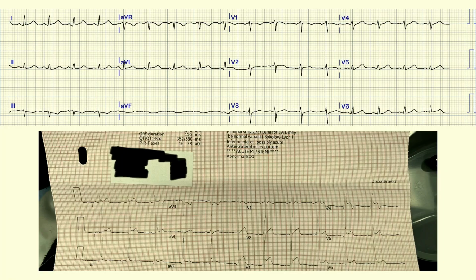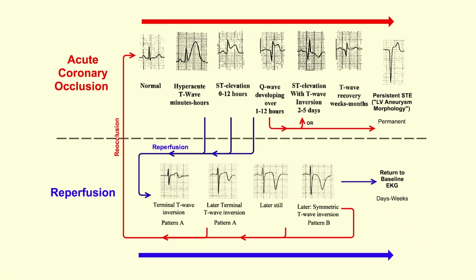ECG can be really subtle, and understanding ischemia is not as easy as they may have led you to believe. I think this is probably the single most important image that I feel was never shown to me, which is the dynamic nature of acute coronary occlusion. It's not just this fixed thing where they're at home, they get a STEMI, and then it just stays right at that 1 millimeter cut point, so nice of the human body to obey the metric system.